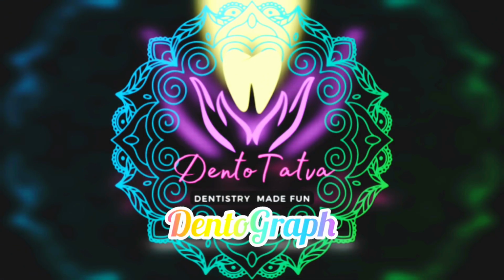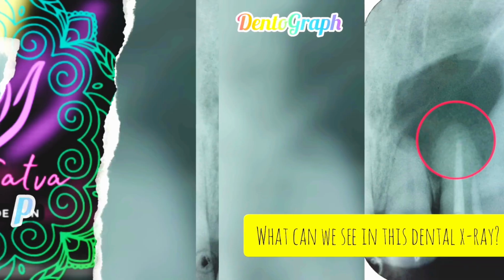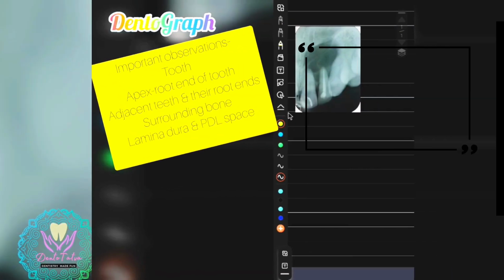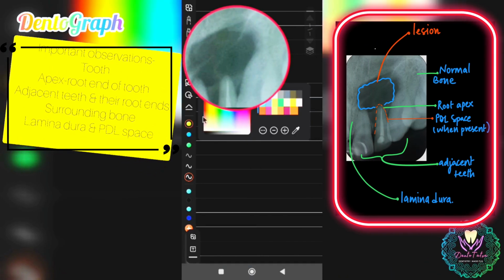This is our brand new section, DentoGraph. We take up random radiographs from our routine dentistry and try to understand the story behind it. For today's session, this is the radiograph that I have chosen.